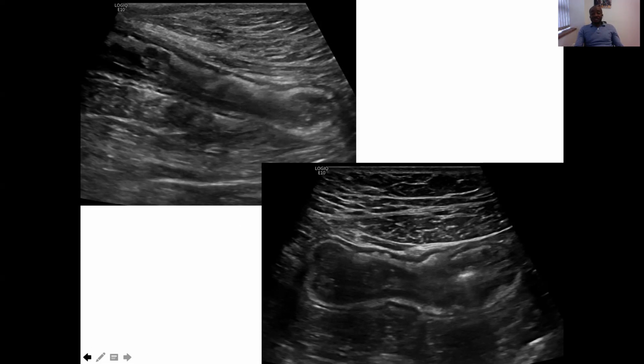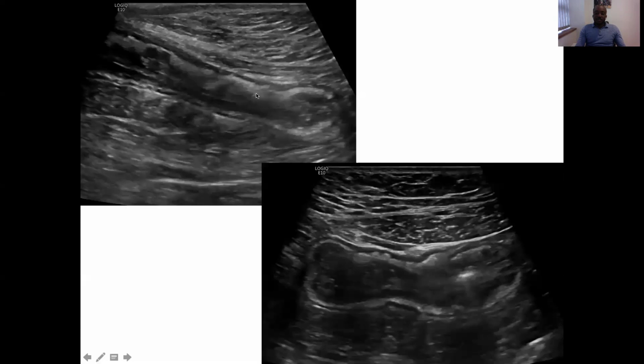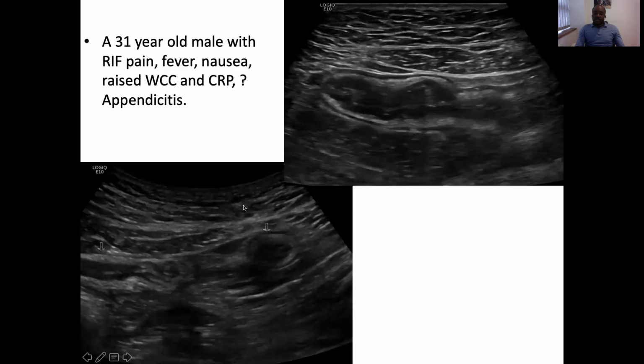So I'll probably pause the video and ask if anyone can explain what they've seen on the screen. If you look at it here, I'll just be quiet for a bit and show you both images. Tell me what you think it is, or you can put it in the comment section, and then we'll see what it might be.